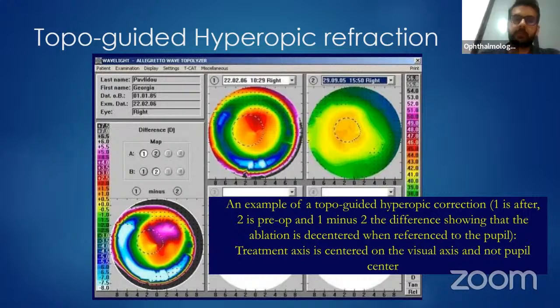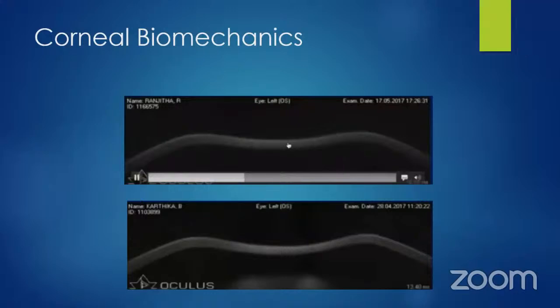Yes, ma'am. So just going to the other part, which is the corneal biomechanics. The upper image just shows a normal cornea. When a puff of air is put onto the cornea, it shows the movement. When you record that, you see that the elasticity with which it bends and springs back to normal is much more delayed, and more after-movements are seen, in the keratoconus cornea.